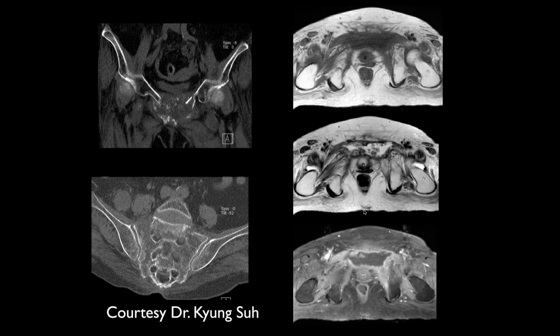Well, I wasn't sure. On the pubic ring, it almost looked like there was soft tissue density within it, but I guess that's incorrect. So these could just be... I mean, it almost looks like there's bony destruction. Okay. And what about the sacrum? The sacrum, I don't see the cortex superiorly along the right side of the sacroiliac joint. It just looks gone, and fractures there. So what do you think's going on here?